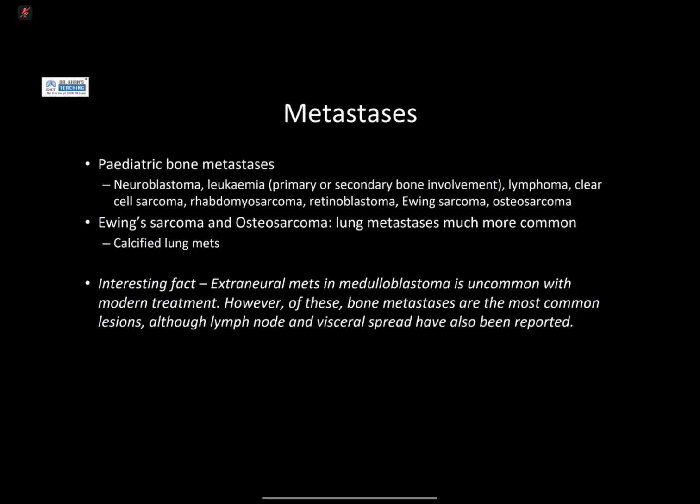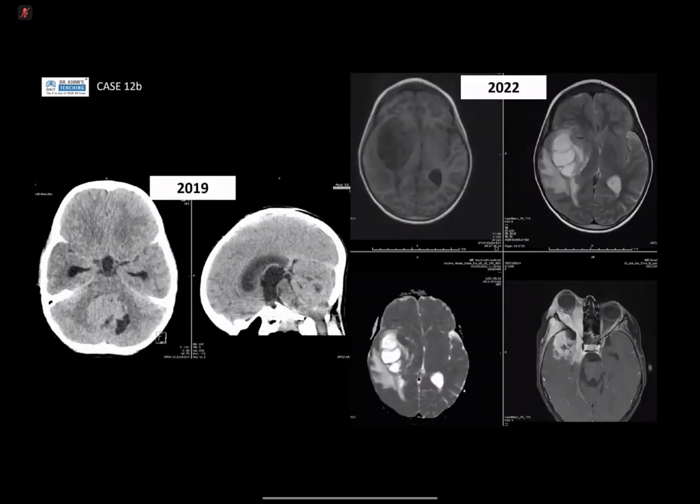And actually, that was a medulloblastoma. Yeah, it was a medulloblastoma, and if you go back one slide, in posterior fossa tumors in kids, I know this can be a bit different in adults, but we are doing a pediatric talk. So with a hyperdense posterior fossa tumor in the fourth ventricle, the first thing you think of is medulloblastoma. Yes, you can think of other things like hemangioblastoma, but this is a non-contrast scan, and you'd expect contrast enhancement with a bigger cystic component. The other thing you think of is a pilocytic astrocytoma, again with a much larger cystic component.